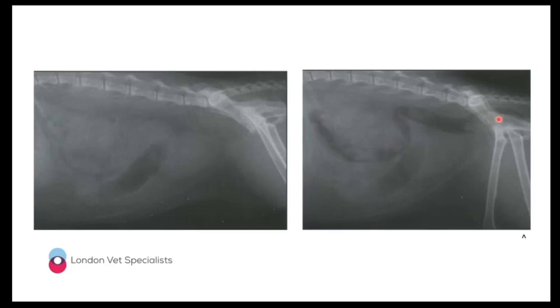And we can see that we've got a fairly empty descending colon, and that this dilated loop of bowel is nowhere near that. So this absolutely is a markedly dilated loop of small bowel. It's definitely not large bowel, and we can now be super confident in recommending surgery for this patient. So just to make you guys aware of pneumocolonograms and just how useful they can be.